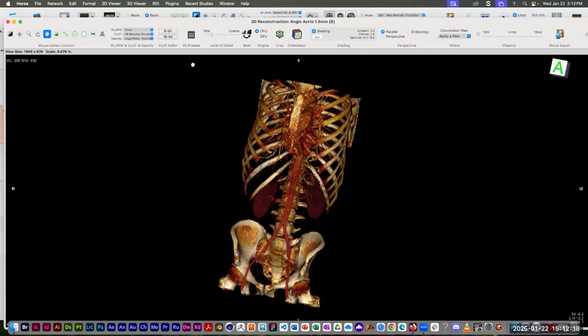what colors are assigned to those different gray values. And that can be really, really powerful in helping you distinguish tissues that may be very close in value to one another. You can make some very subtle little tweaks to the coloring and even to the transparency of different pixels in the image to make some things more obvious than others, make some things stand out better than others. So when I click the 16-bit color lookup table editor, generally we use the 16-bit one. It just gives you more choices in terms of colors.